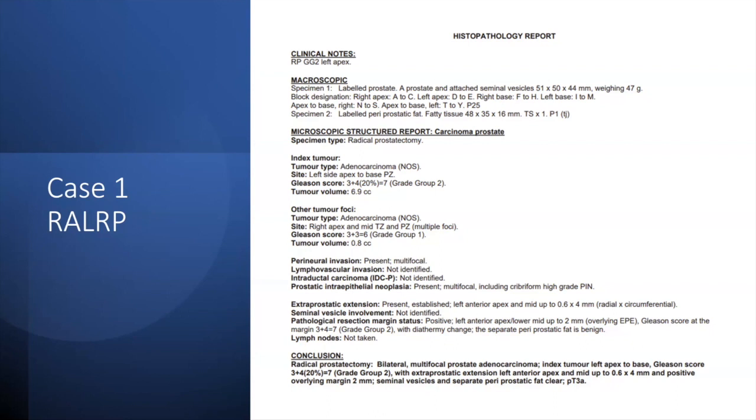And so when we go forward, one of the reasons why this man may have a potential outcome is that he had a large tumor. And if I just report the percentage pattern 4, even though that's important in itself, the volume of the actual tumor is also significant. So we saw pretty decent volume on the biopsy, even though there was a preponderance of pattern 3.